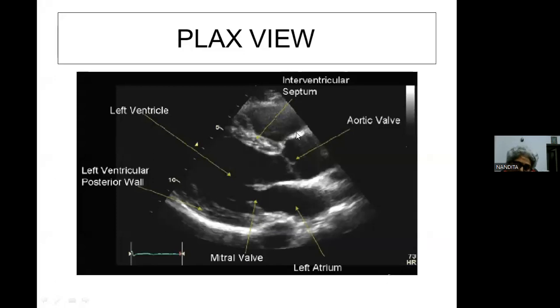So you have this line, correct? And look at this, it's a thick line. It begins here and it ends here. Are you okay with that? Whichever it begins with is the leading edge, because it's leading. This is your reference point, so the line closest to that is the leading edge, and the ending line is the trailing edge.